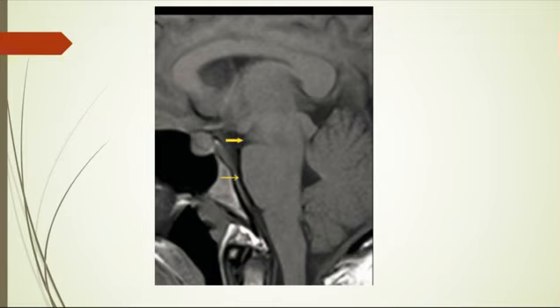What's this? How do you describe this midbrain appearance? You can see this dark line here. No, this black line we put it. This is for demonstration. This one. What does it show you? This is what's called sagging or swelling of the midbrain. Sagging, meaning something relaxed, let go. A relaxed midbrain, indicating, as you said, intracranial hypotension.